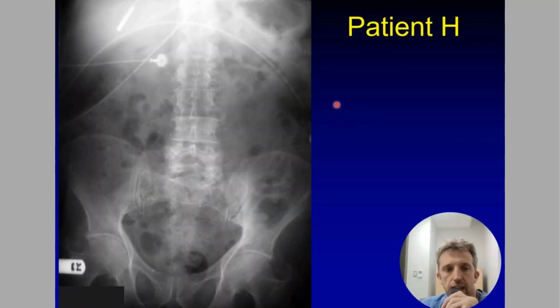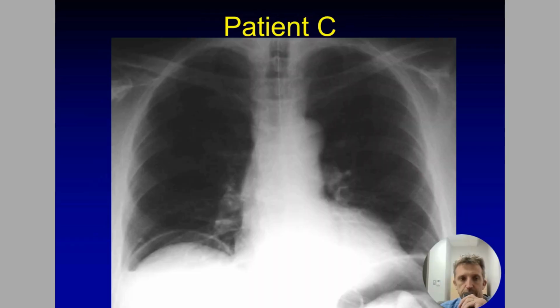Okay. How about this patient? Stones, bones, mass, and gas. Anything radiopaque? These are EKG leads, but what is this thing? This might be the most important radiograph we see today. July 1 new interns: this is a feeding tube in the right main stem bronchus. That needs to be repositioned. Everything else is okay. Don't miss that!